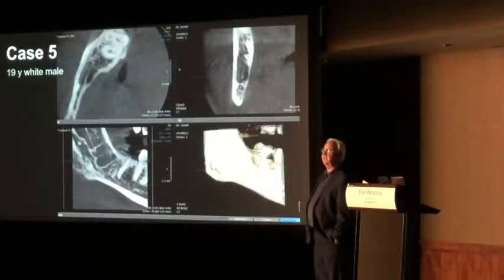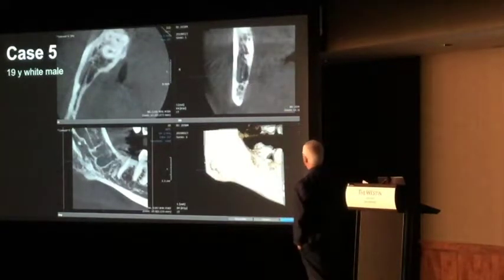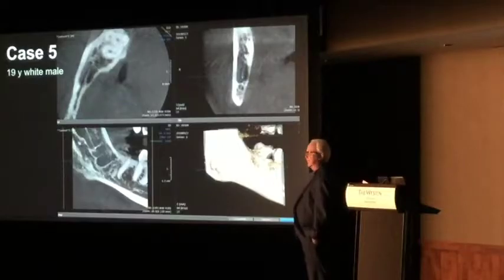So I don't know, you've got 50 years of research right there, okay? All of y'all. That's a good Texas expression, all of y'all. So I went in there looking. This was not referred to me for anything. It was a cone beam scan they did, a small field of view, and I'm looking at those, and I said, I've got to show these folks these images.